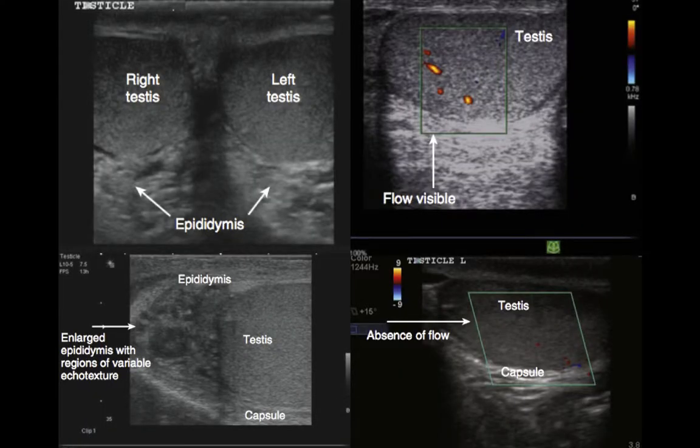So we can compare each side to identify whether the problem is inside the testicle, the epididymis, or around the structure. Just like this one, the testis is fine, the problem is here: the epididymis has very prominent swelling that is easy to observe. And in this one, when you turn on the Doppler, you can see the flow signals. That's normal. But in this picture, you can see the absence of flow inside the scrotum.